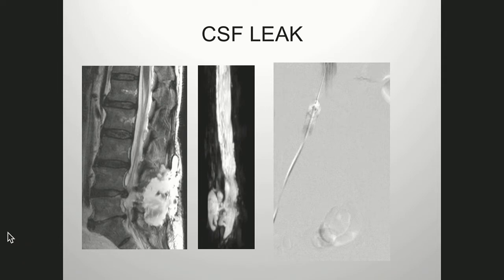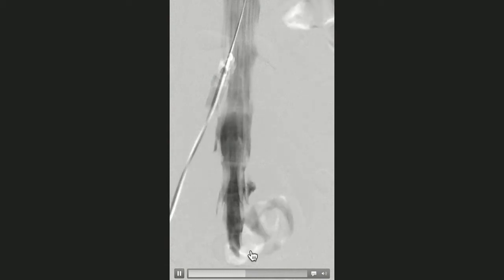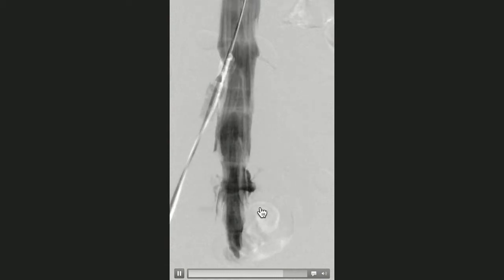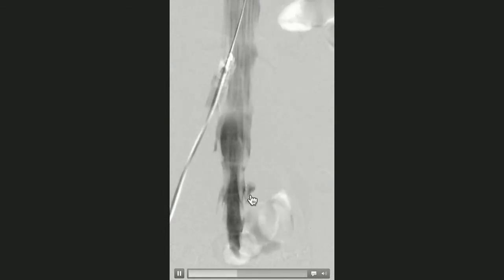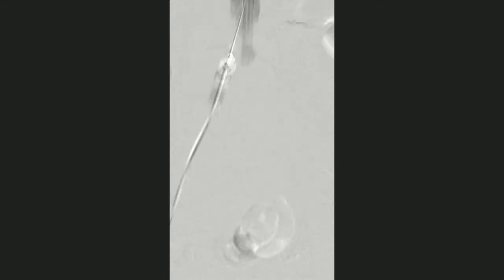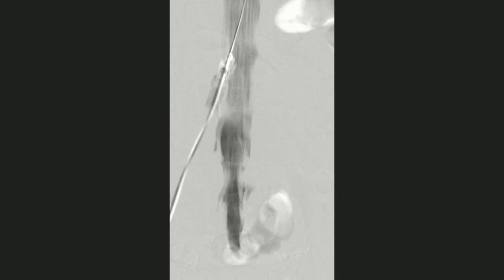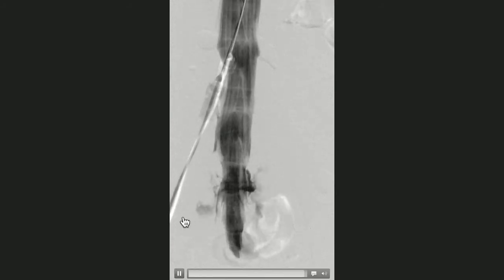Nevertheless, you can see in imaging of MRI spine, routine sequences show a large collection in this patient, which is obvious on the myelogram with a typical tear at the time of surgery on the right side at L4-5. But we're here to talk about spontaneous intracranial hypotension and leak, and let's discuss the imaging.